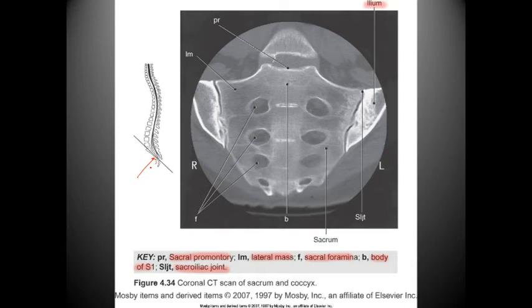I've shot some good sacrum and coccyx, and I've shot several bad, just simply because you're obscured by the patient anatomy, whether it's the patient's too large or the patient has a lot of fecal material, and there's no way that you can actually go in there and shoot this and get a good image. So this is typically, if you want to see abnormality, this is going to show you the best.